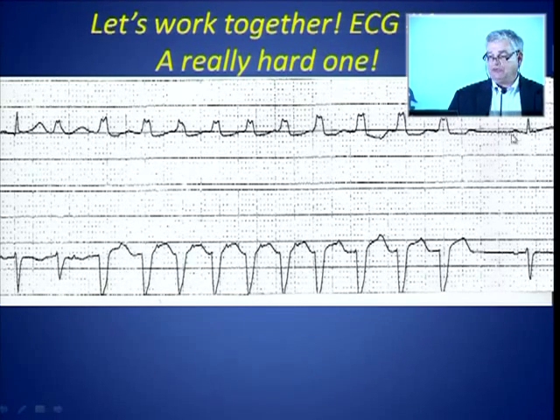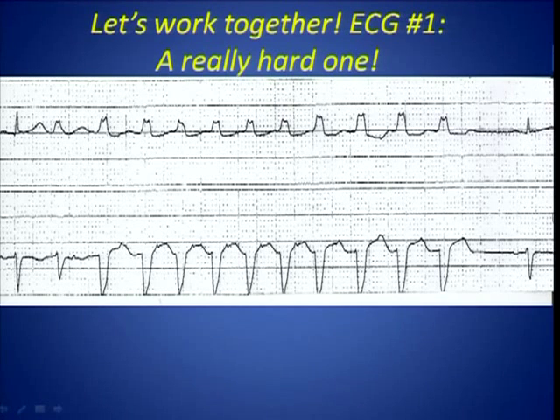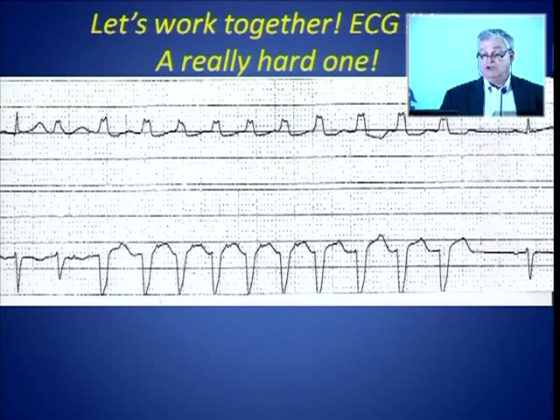We see at the beginning and at the end what looks like a sinus P wave. This is lead 2, this is lead V1, followed by a narrow QRS that looks normal. So that is probably sinus beats, and the sinus beats are narrow. What else do we see?